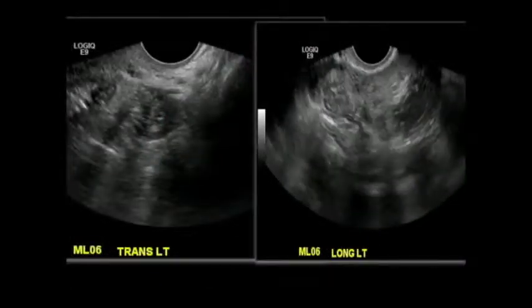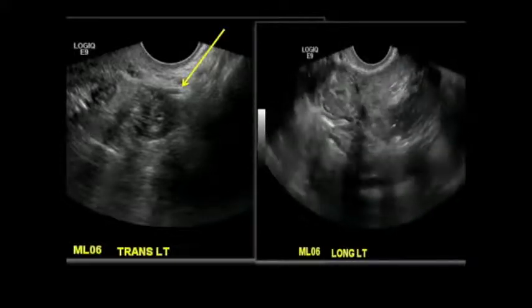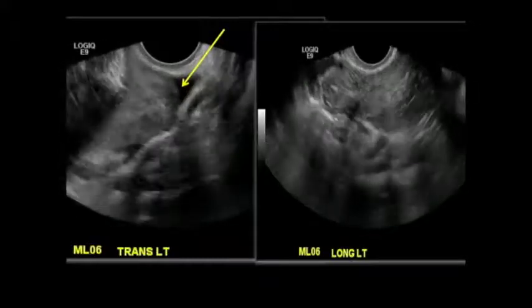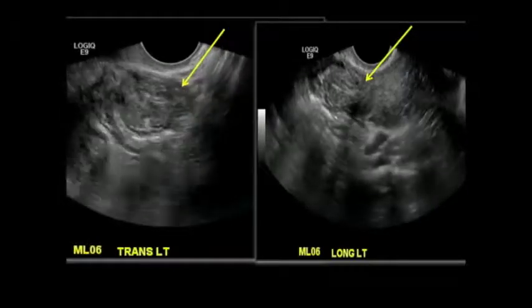So this is an example when there was a dermoid, and you could see that the twisted vascular pedicle kind of looks mass-like next to the ovary. See, the other cine is not playing. Here it is. You can see the twist, and next to it was the ovary with a dermoid. So really look for those. This is very helpful in those cases.